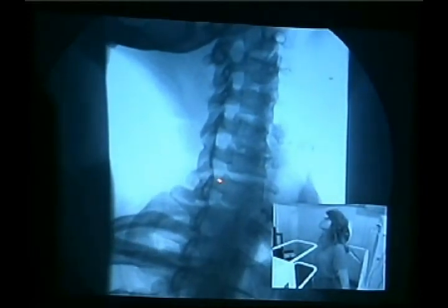The insurance company on this one said she was faking it. Her bills were $35,000. They said, we're going to give you 20 and you go take a loan out. So the lawyer, I did this. We went to court, and $164,000 later, they paid all her bills, and the attorney goes, I can't believe this. Watch right here, these 2 bones will separate. And she said, that's right where my pain was, back in her neck, right there.